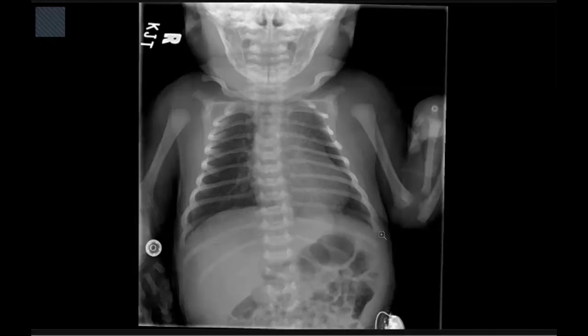So the lung lesion, what's your differential? I told you my differential is pulmonary sequestration or small diaphragmatic hernia, or other pathology, maybe a small cyst, pericardial cyst or congenital cyst. Is it the typical location of a pericardial cyst? No, this is not the typical location. What will you do next for this patient?